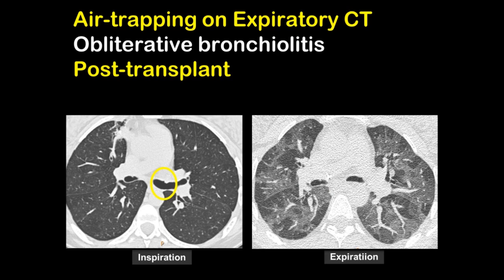This is a very interesting case. It's a patient that had a lung transplant, and the patient really knows her pathology. When she performed a functional test, she had a reduced FEV1, so she went and talked to the pulmonologist, and she is concerned about this finding. So a CT was performed.